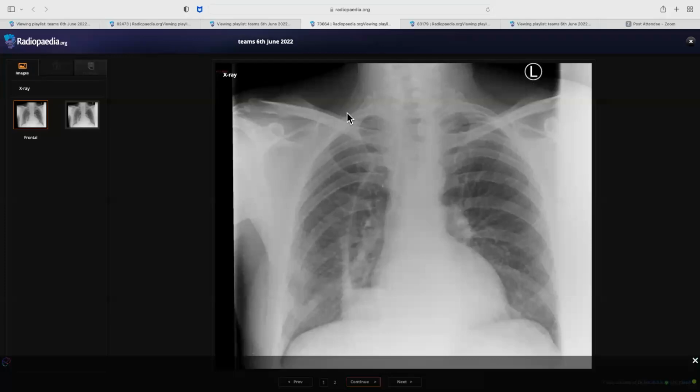You mean you are talking about just the linear structure, or the entire thing? This is the linear structure. Okay. I told you the patient had previous surgery, so I can tell you that this appearance is because of previous surgery. Can you tell me what surgery would have happened and what problem the patient would have had? Can you see any other sign of surgery on this radiograph?